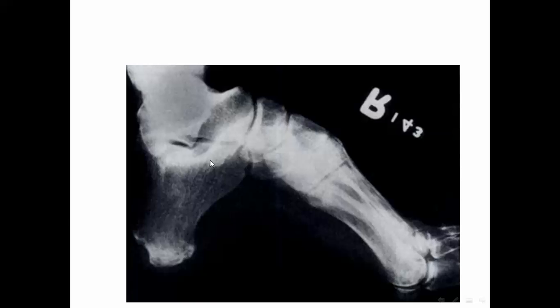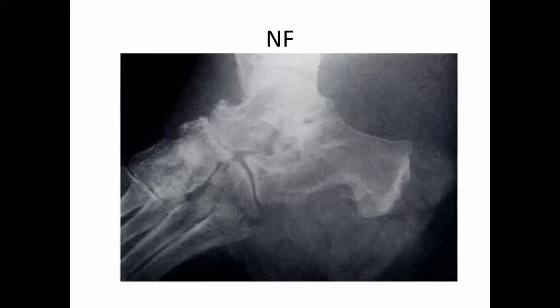If you have this one, we call it high arched foot, and this is characteristic of paralysis or polio. Neurofibromatosis can produce soft tissue masses and at the same time indentations on the bones. This is neurofibromatosis.